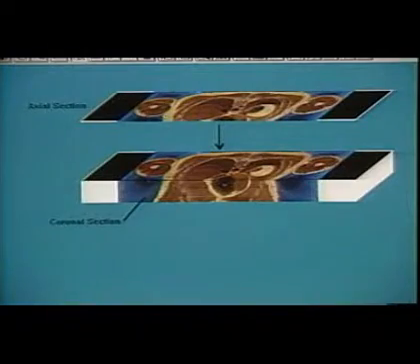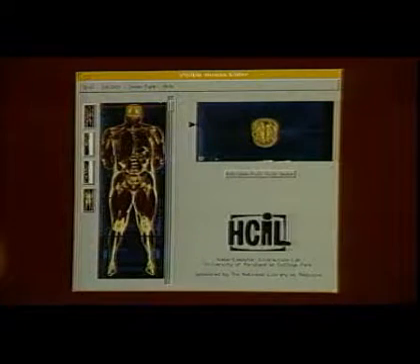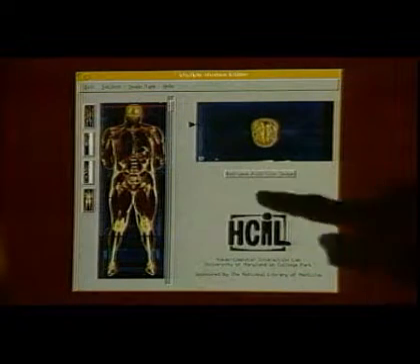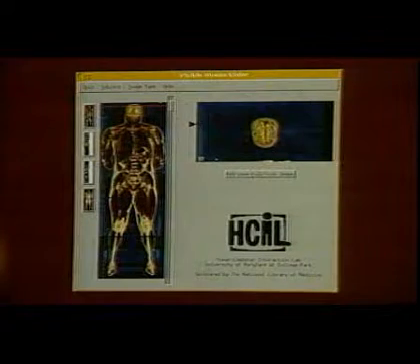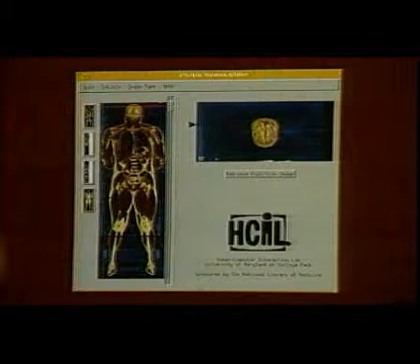Our first prototype demonstrates a general interface for volume exploration. For the Visible Human project, the volume is defined by the anatomical slice images. From this volume, we can generate other views such as coronal sections. This direct manipulation interface presents a thumbnail image of a coronal section of the cadaver, reconstructed directly from the axial cryosections. This image acts as an overview, giving a visual representation of the entire database.